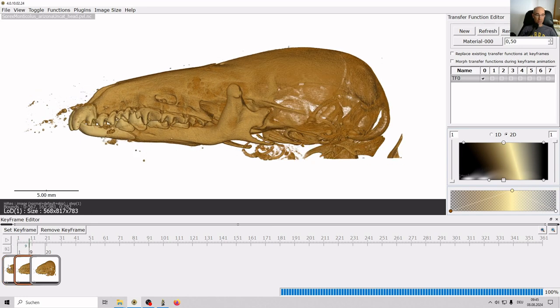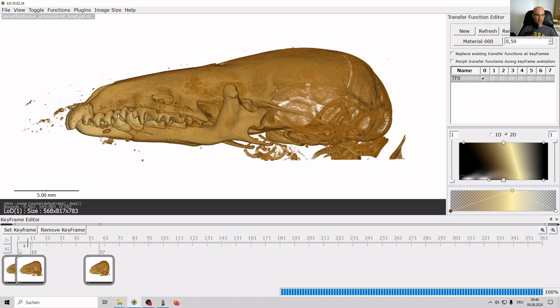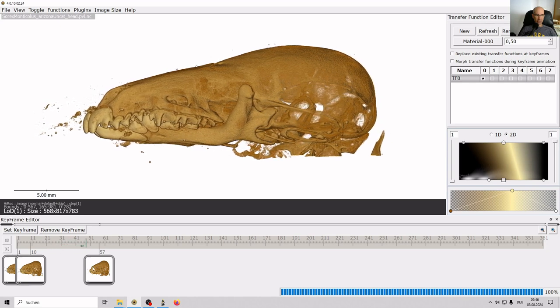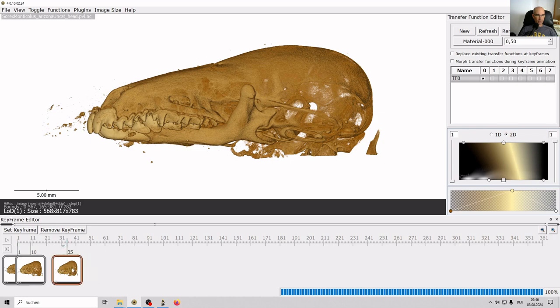So the main thing is that I just accidentally moved that keyframe 1, that image 1 keyframe. And by the way, you can do that too. You can drag these things so that when it gets from frame 8, it's going to turn much more slowly because there are all these slices in between the 2 saved keyframes that you made. So, that's good to know. Anyways, I'll move this back to where it was, which I think was 20.